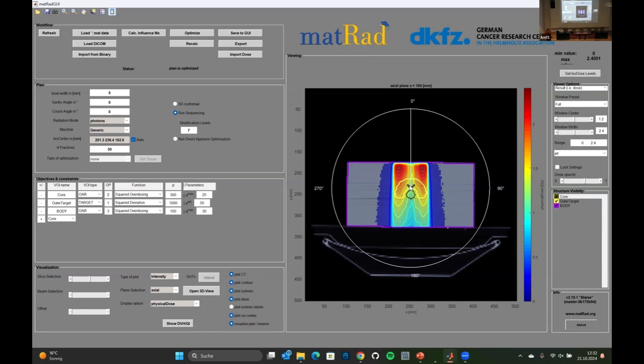It's the only thing the optimizer can do with this single beam. It doesn't have any options to distribute or accumulate dose in the target. You will have insanely high doses here just to get to the prescribed dose in the target. Basically, there's not much to do in this case.